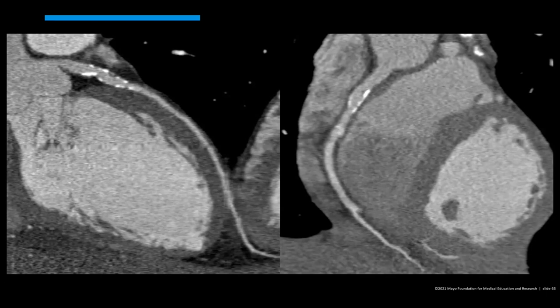And so the question is, what does this patient have? Sure. So the most common cause, at least in the US, is just atherosclerosis for coronary artery aneurysms, which makes sense with the calcified plaque as well. Okay. What other diseases can give you coronary artery aneurysms?